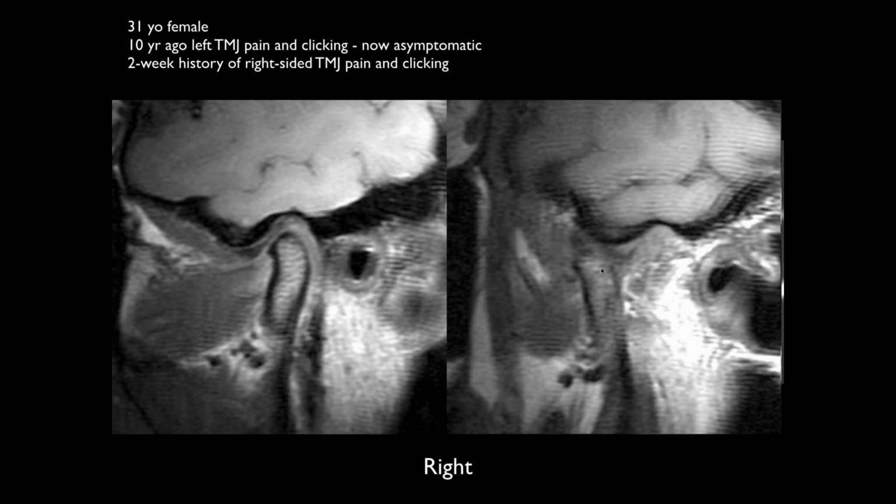I mean, that's the open mouth view. Yeah, I think it's probably catching part of it there. It's definitely catching the disc, I'd say there. Well, but it's captured before too, right? Yeah. The disc is really in normal position here anteriorly, and the margins are a little bit poorly visualized, with a little bit of increased signal intensity, but it looks like it's pretty normal position, and there's actually maybe a little bit of hypertranslation here.